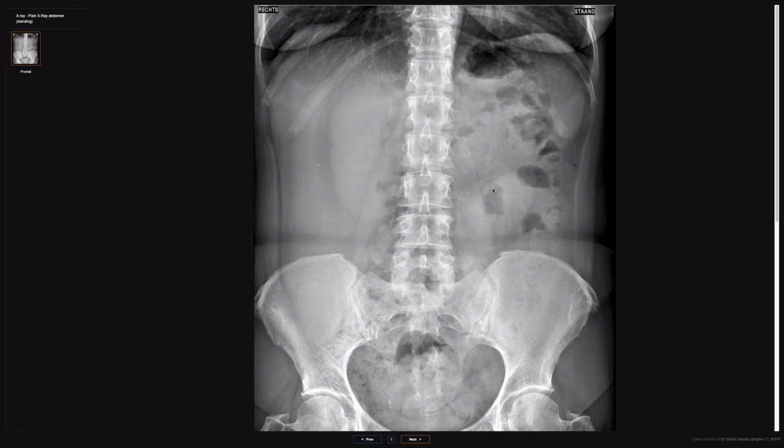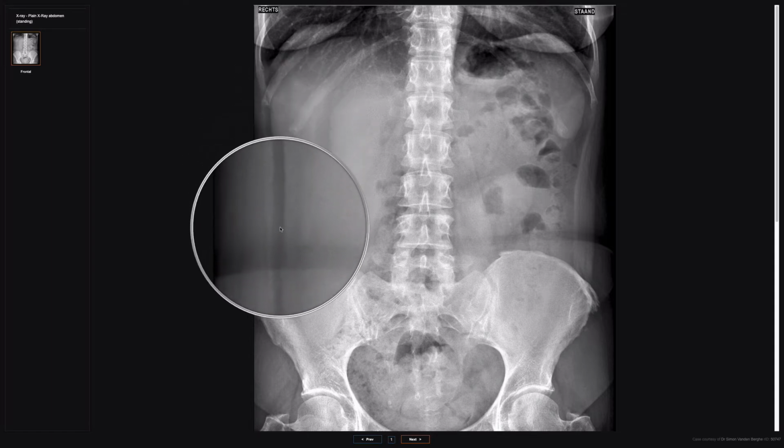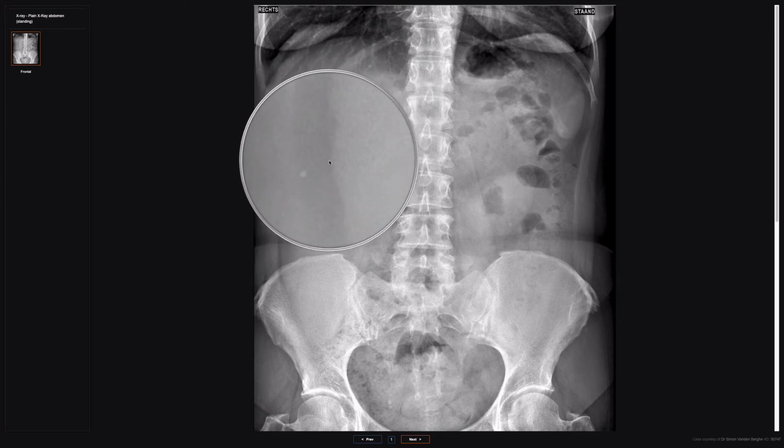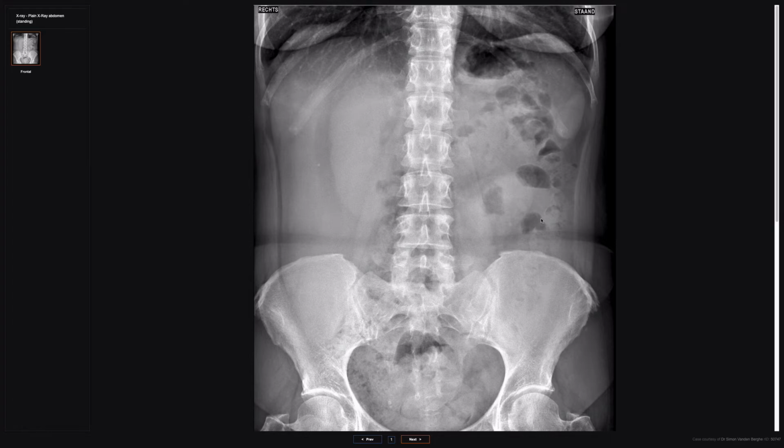And the reason we can see the organs and soft tissues is because of their outline, and more specifically the fat that outlines the organs, which allows you to differentiate it from the adjacent structures. It's about tissue density, like we talked about before. So here, along the edge of the liver, this is fat, and that allows me to define where the liver is. I can make out where the kidney is, because look, just around the kidney there's a bit of fat, so I can see the edge of the kidney on the left and right side very clearly.